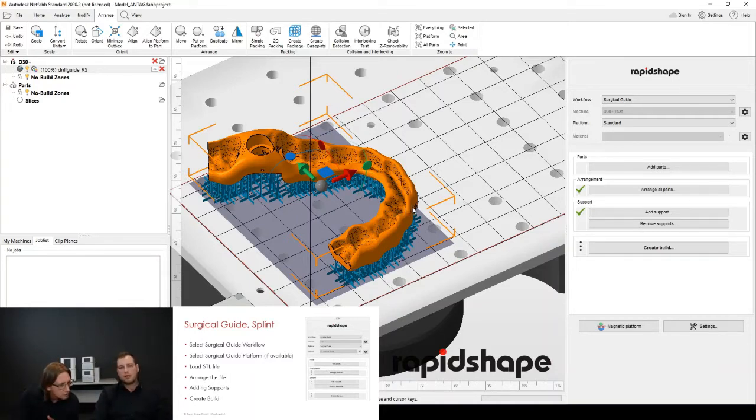Jeroen is asking about how to manipulate the width of the predetermined or approved support scripts, and how to avoid the holes. This is something where we would suggest using a base grid. That simple. Or with this surgical guide, it has its own grid.